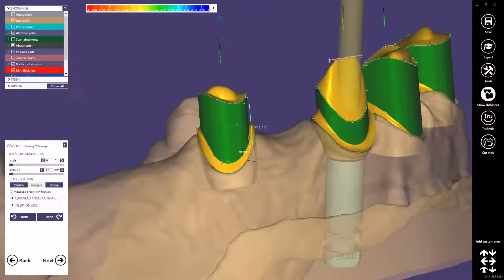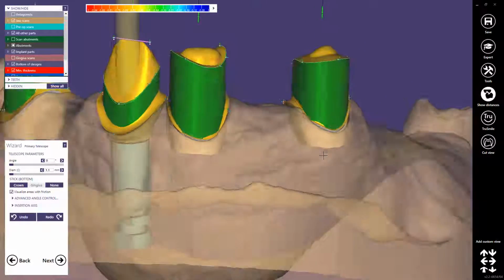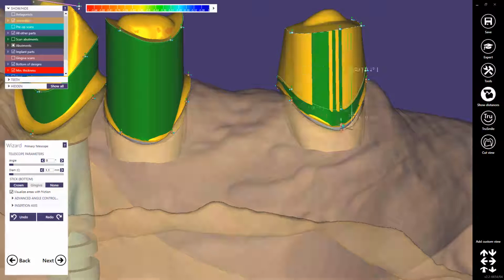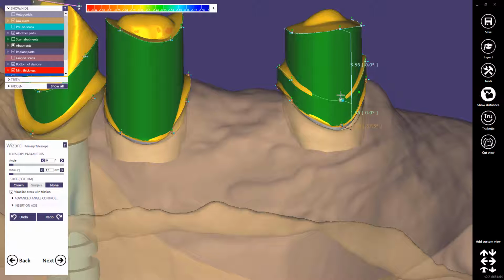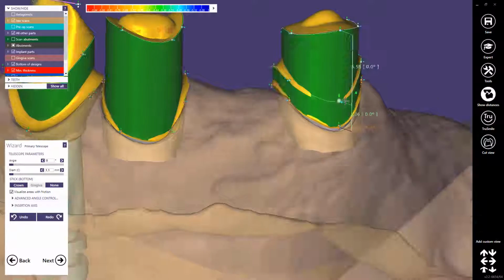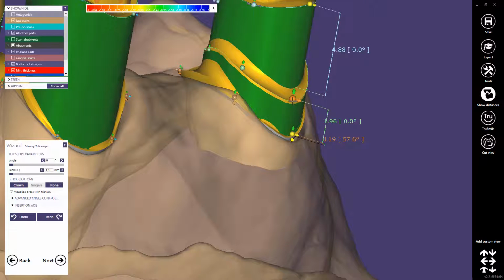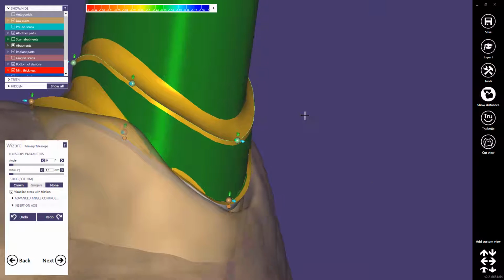You could also create a second curve. Let's show it here. For example, with Control Shift and left you can add another curve. You can then define two friction areas, and you could now move this one, the upper one, inwards and create it as thin as possible.